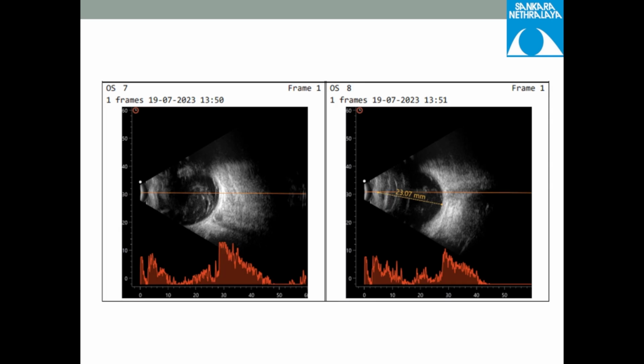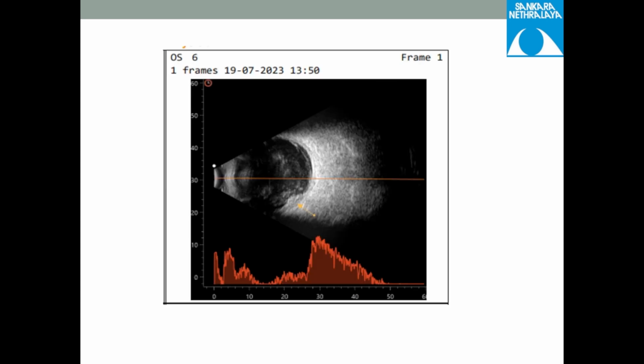Describe the ultrasound here. This is the ultrasound scan of the left eye. The first image on the left-hand side shows no definite lens echo noted. There are a few clump echoes seen in the vitreous cavity. Membranous echo overlying the retina with submembranous dot echoes noted, moderately reflective. On the right-hand side, the axial scan shows the lens echo with dot and clump echoes in the vitreous cavity. The retina appears attached.